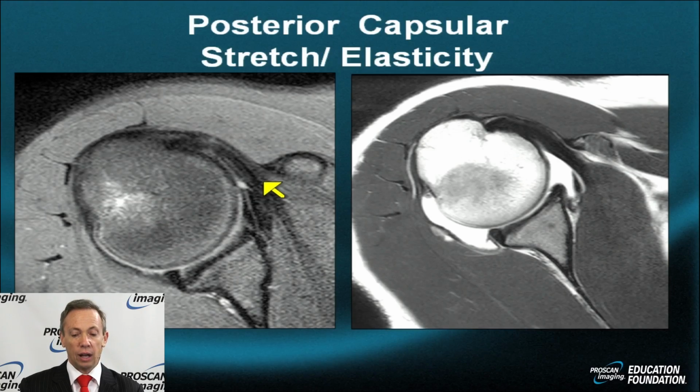We see this here on a distended arthrographic view. It's not apparent on the non-arthrographic view where we see the labrum, the capsule, a small amount of hyaline interposition as a normal transition point between hyaline and fibrocartilage, but once we distend the joint, we see how floppy and distensible the posterior as well as the anterior capsule is, as it must be to allow range of motion in the throwing athlete. So in the throwing athlete, this may not necessarily be an injury. It can be and is often normal posteriorly and postero-inferiorly.